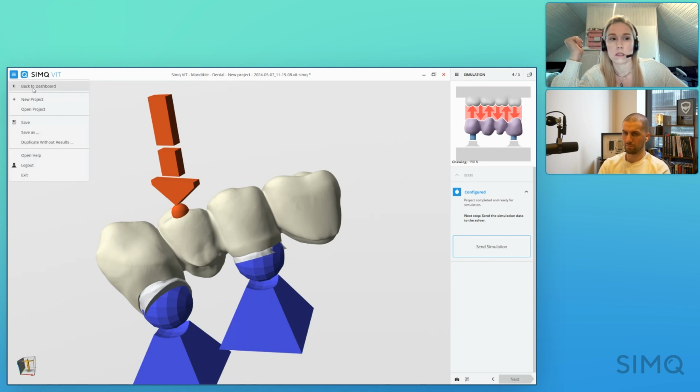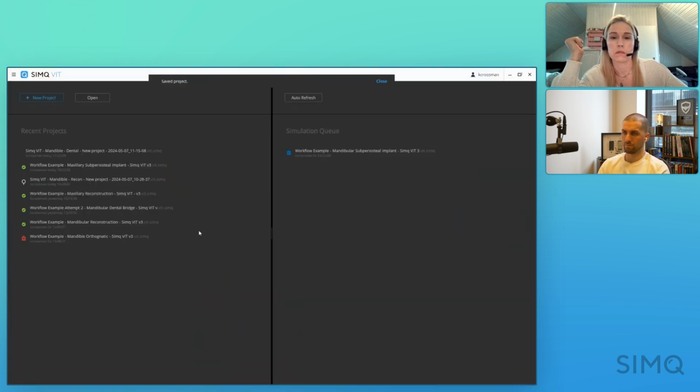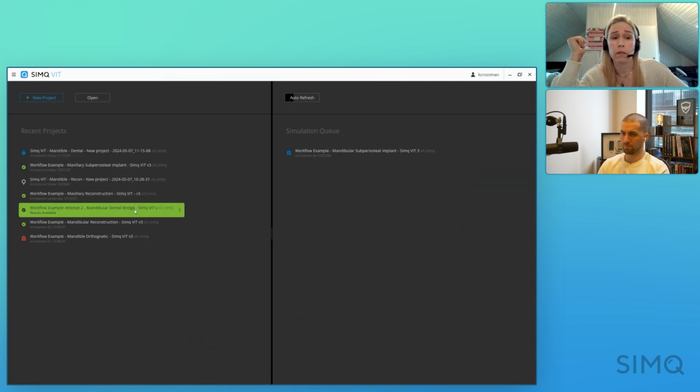I think that's it. So we can just go back to the dashboard. I can show very quickly the dental bridge here, the results.